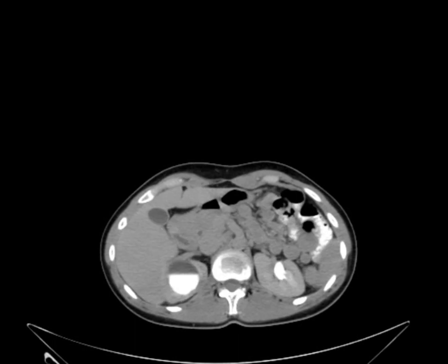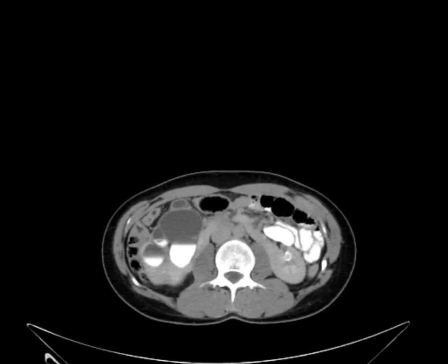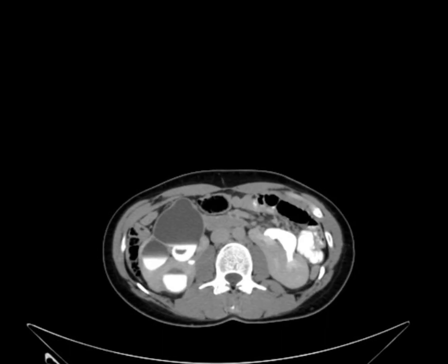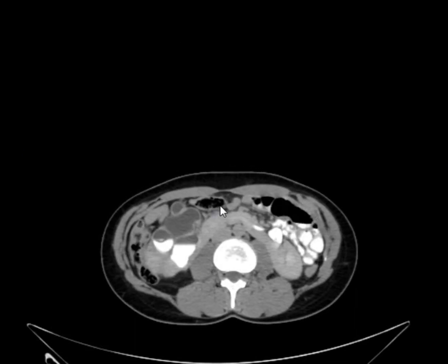In horseshoe kidney, one of the complications or associated anomalies is malrotation, which results in kinking. What results from it? Hydronephrosis due to some sort of PUJ stenosis. Is this right kidney functioning or not functioning? Functioning. It's excreting. So it's not an obstruction. It's stenosis. An obstruction would be non-functioning.